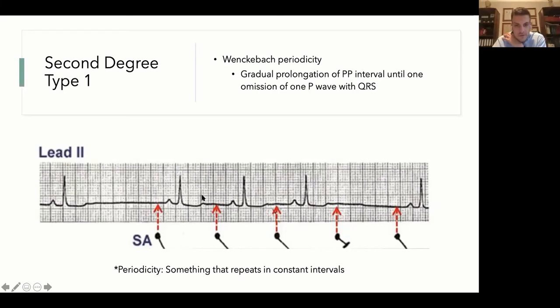the node fired. This is where the node fired, but the interval from P to P, let me draw it actually. As you can see here, this interval, can you see it? It's not this interval here, is less long than this one.